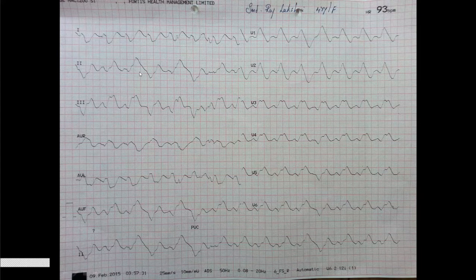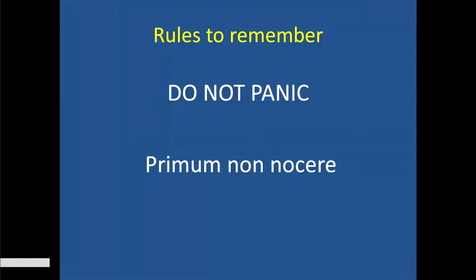Lastly, what is the fun if you don't show an ECG like this? This is a 47-year-old lady who presented with extreme fatigue but alive. What is this? What was the first slide with workup that I mentioned? Blood test, metabolic causes. This is a sine wave pattern, very classical of severe hyperkalemia. Fortunately, the patient was okay. We dialyzed her, she fully recovered, and is fine. Always remember, wide QRS, think of metabolic causes and drugs.